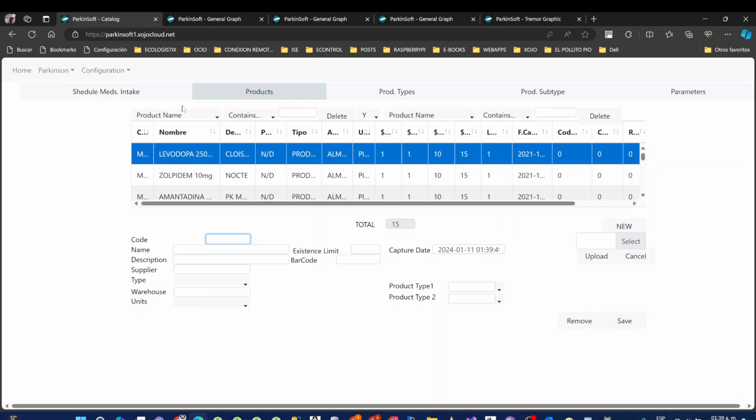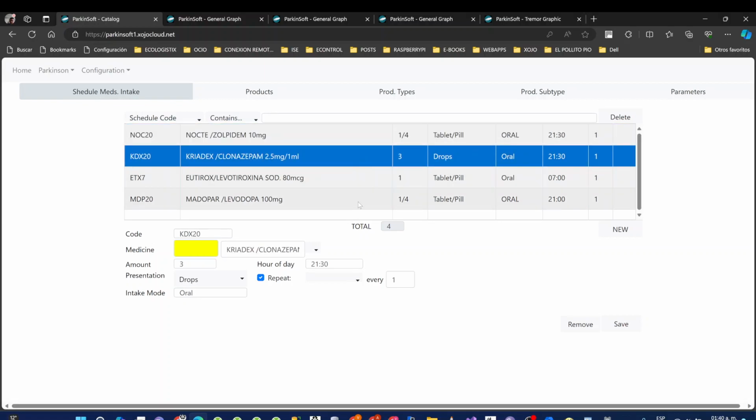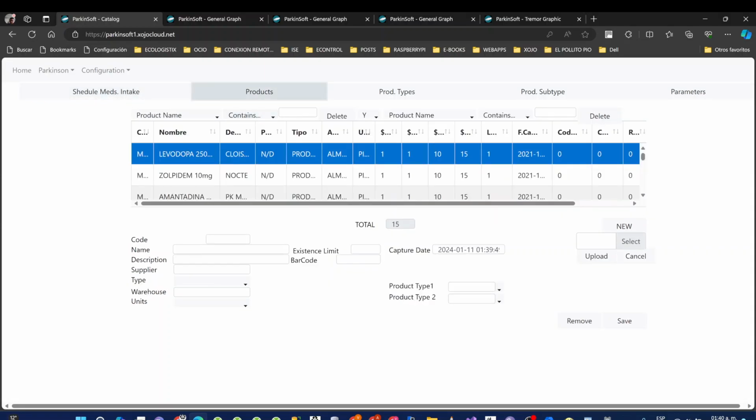Medication consumption and time to take medicine notification. Capturing medications can be done automatically, or manually. Neither of the two guarantees that the patient consumes the medication, therefore, it is important to ensure the consumption of the prescribed medications in a timely manner. If everything is configured correctly, the watch will vibrate and ring displaying a medication consumption notification. The patient should then take the medication displayed in the watch notification and close the notification on the watch.